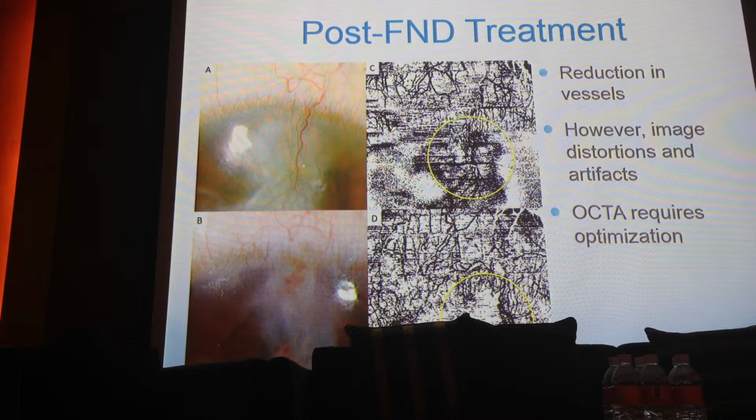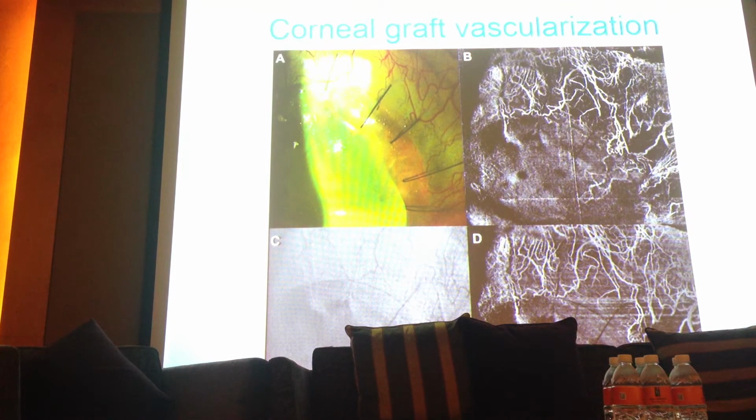Yeah. So these are the perils of OCT angiography, and you don't have an angiogram scan in that, though we did one. I didn't include it, but it didn't give us more information. I mean, there was flow there. It was flow. Yeah, absolutely. It was red. I don't know. Anyway, just something to keep in mind.